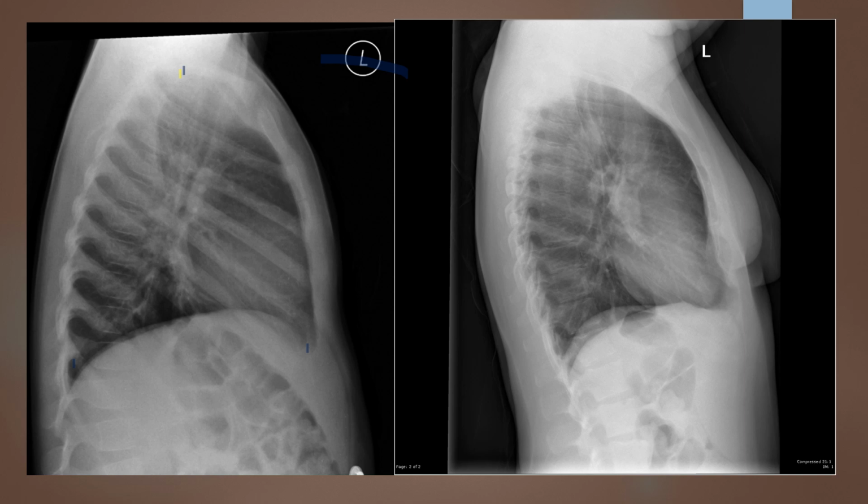Now we can go to our mid-coronal plane. We're looking for our mid-coronal plane to be perpendicular. We're going to evaluate that by looking at the posterior rib superimposition. We are definitely under a 1/2 inch of separation between our posterior ribs. We have them right here and here.